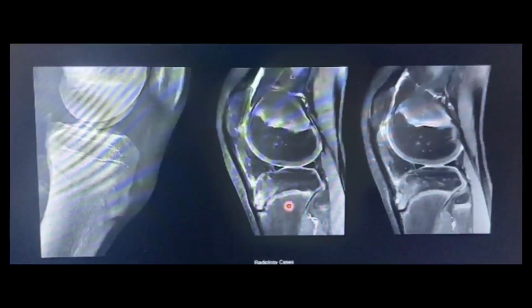This is the radiograph and the MR images, and on the MR images you can clearly appreciate the distal patellar tendon where it inserts into the tibial tuberosity, and the tibial tuberosity area showing slight fragmentation, and also bone marrow edema can be seen. So a simple radiograph can also be helpful. For further detail, the MR examination is good, and you can also advise ultrasonography.